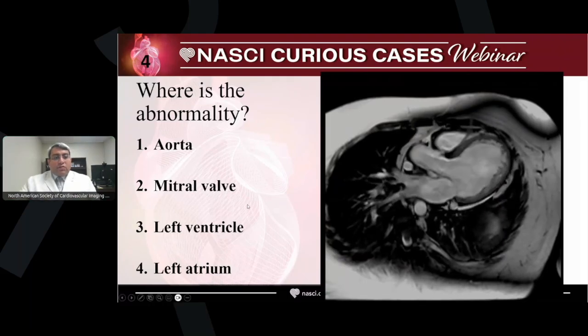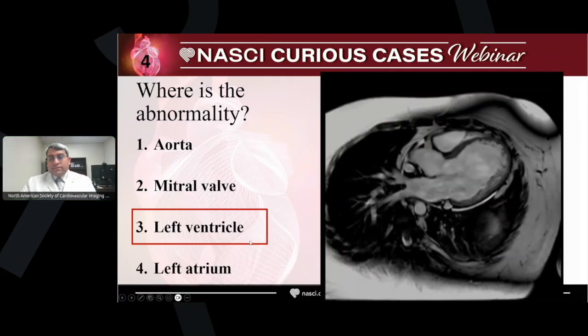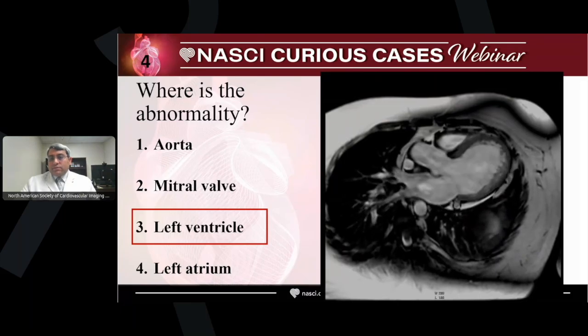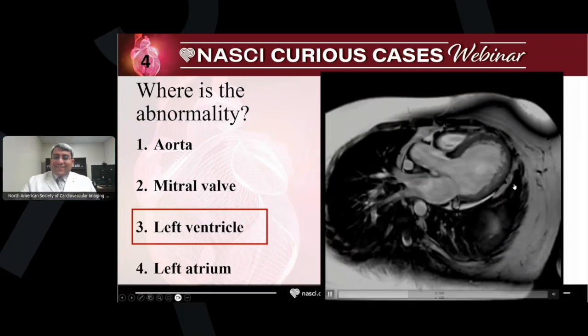Excellent, yes. So this patient has, can you tell me what is going on in the left ventricle before we go to the next slide? I think it appears kind of hypokinetic. Excellent. Yes, hypokinesis, and it is dilated as well. Exactly. And also, additionally, there are prominent trabeculations here. Yeah, I was about to say that, but I wasn't sure. No, good for the phone picture, it's too small.